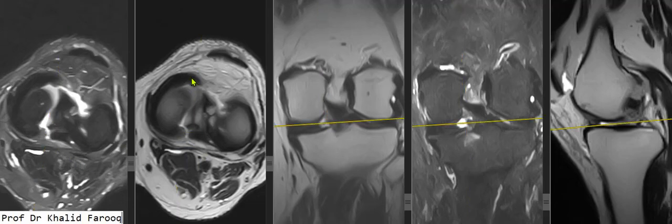This is anterior horn, body and posterior horn, and this is the root of the posterior horn, and we can see a radial tear passing through and through this region. This can also be confirmed on axial T2 fat suppression sequence. This focus is detached from the main posterior root.